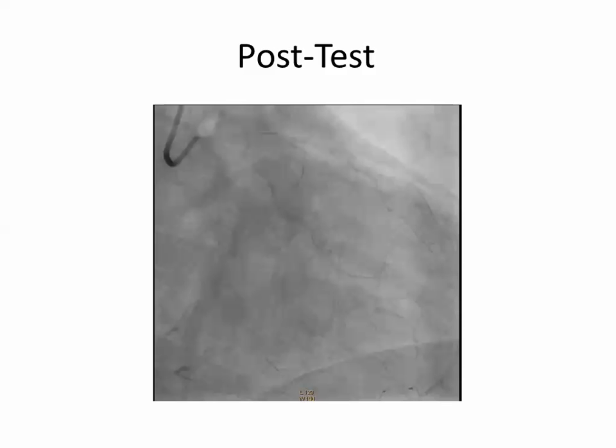You will answer A, B, or C. What's the view? And you will comment on the downward vessel. What's the vessel at the bottom of the screen?